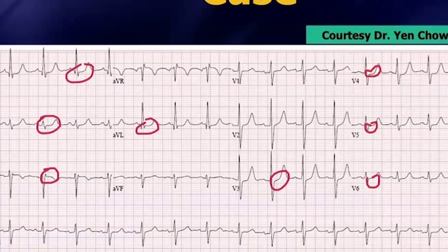And the reason I say that computers are going to call this non-specific is because most EKG computers are programmed to only read a full millimeter of ST segment change as significant. If the ST segment change is less than 1 millimeter, computers have a tendency to call it non-specific. But non-specific should not be reassuring, because a person can, sure enough, have some major disease with only mild ST segment changes, less than a millimeter. And so you really need to be very, very careful about that.